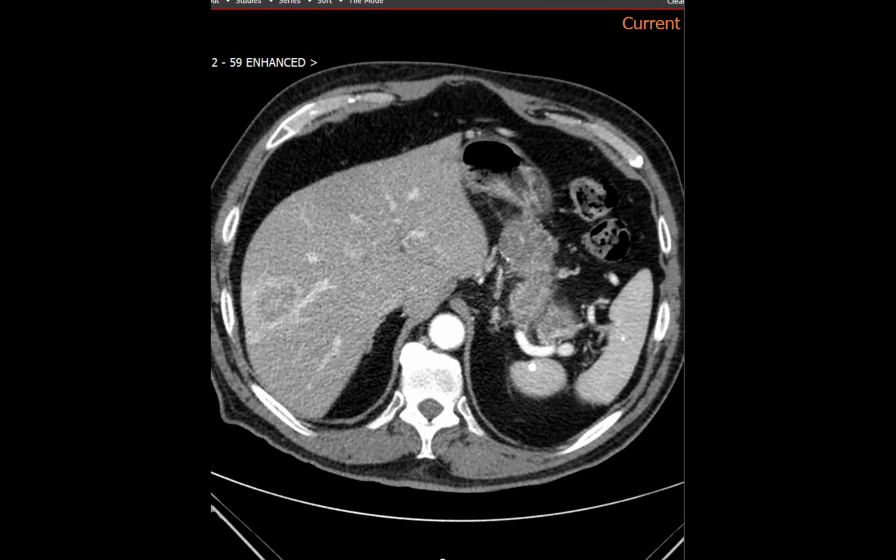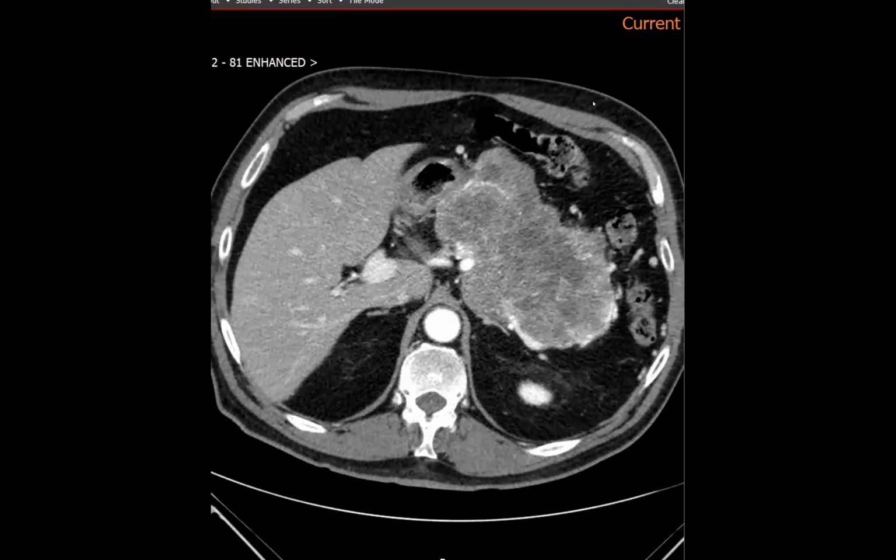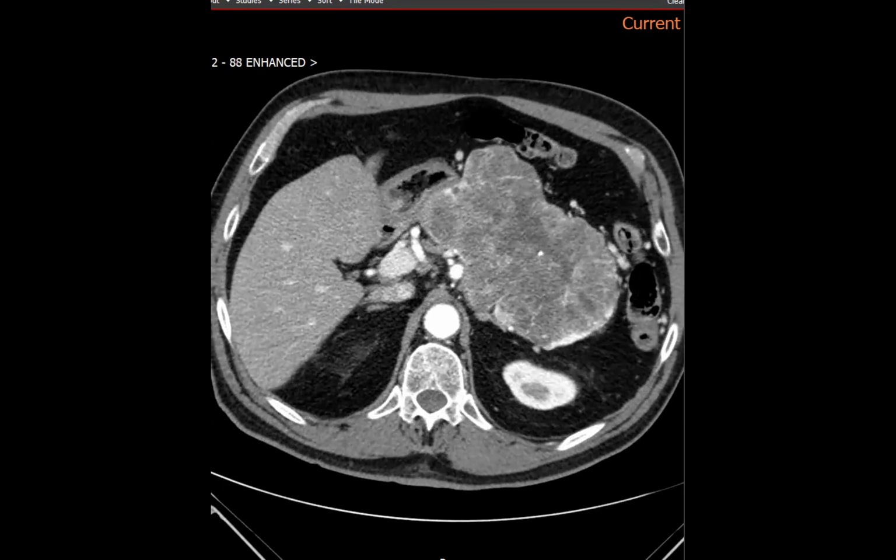Wow. Because I do think there are collision lesions. For example, seeing how massive the serous cyst adenoma is, you could imagine that an adenocarcinoma could arise there and that could metastasize. So yeah, I don't know. But even that report, and I'm not trying to argue too much, the histopath says metastatic serous.